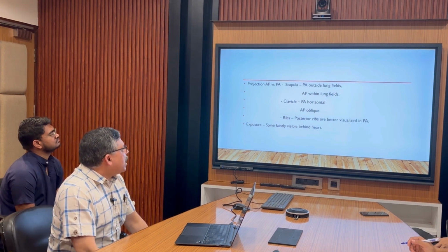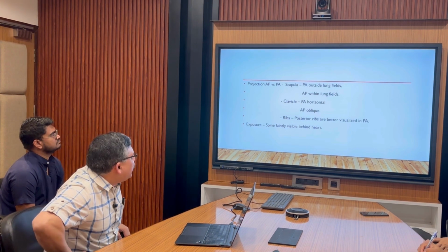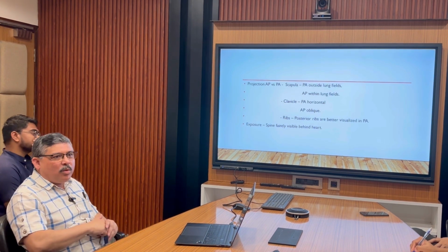So this is one of the most important things: the projection, AP versus PA view.